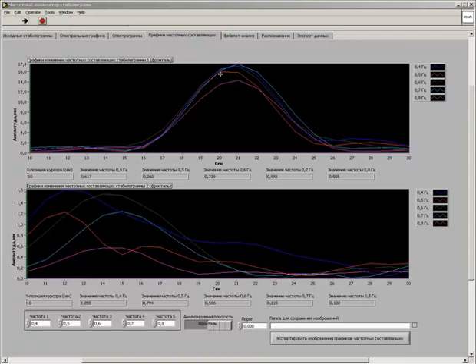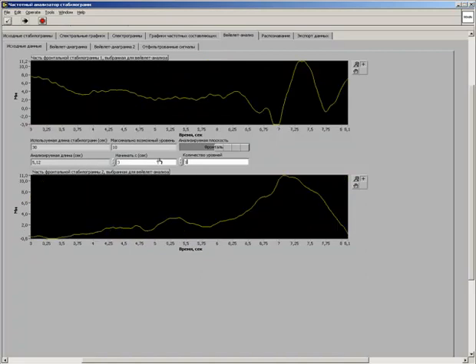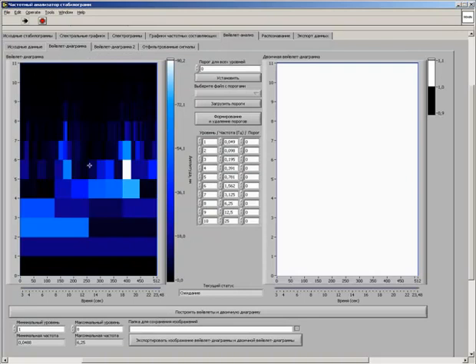The fourth way of stabilograms analysis is the construction of wavelet representations of signals and their binary variant. One can set the initial time and the number of detailization levels which will determine the parts of the signals which will be analyzed. Here are the displays with the wavelet diagram and its binary representation, the correspondence table between frequency values and wavelet diagram level numbers, and the fields with threshold values for which one can construct the binary wavelet diagram.